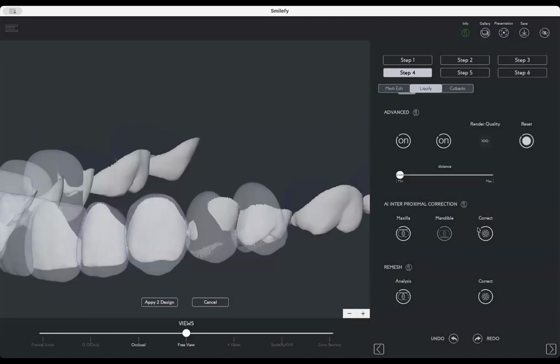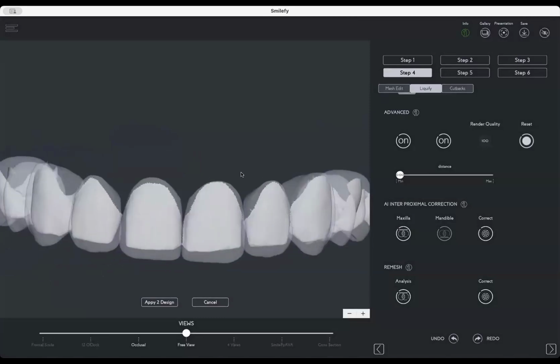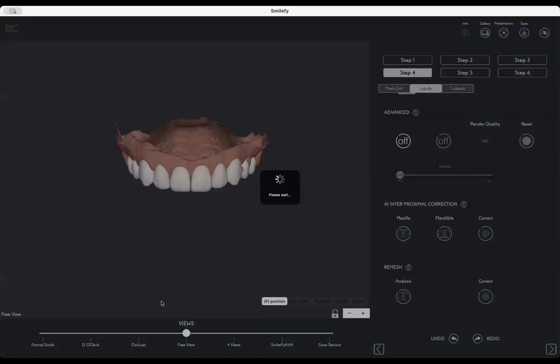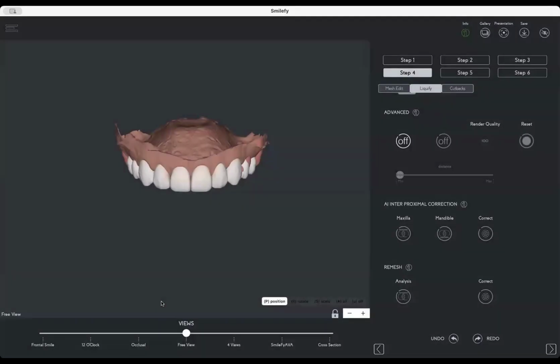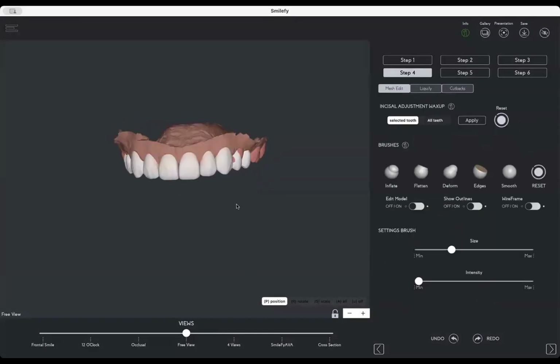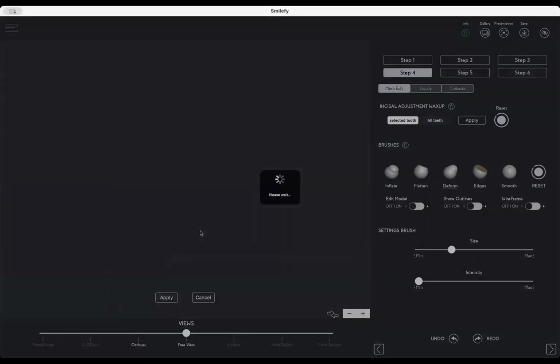Now there is no more overlapping, and you can use this design, for example, for composite veneers. You have clean interproximal spaces, very clean, so we don't cut the interproximal spaces over the overlapping. We revolume the mesh, and we create clean interproximal spaces like this. The mesh edit, very powerful option also. And let me show you some of the brushes, for example.